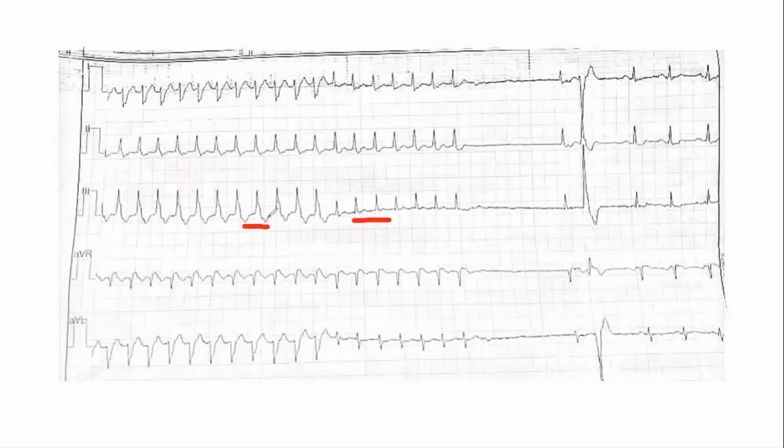You see, these were the P waves over here, and here you cannot see the P waves. They also went away because probably they went into the QRS. So we cannot see P waves over here. So there are a few tachycardias. I will not go into detail, but VT and antidromic are definitely out. So this was SVT with aberrancy.